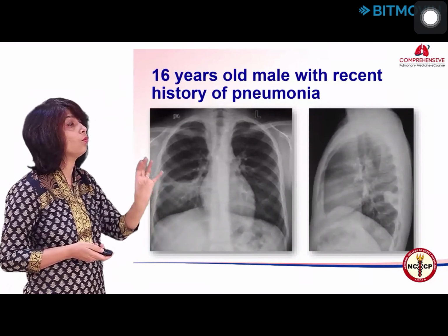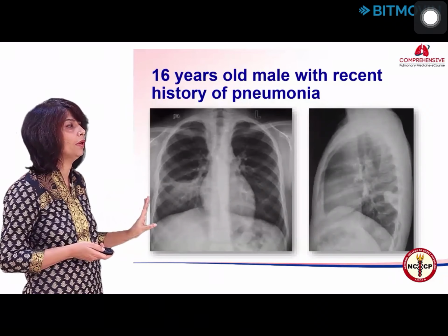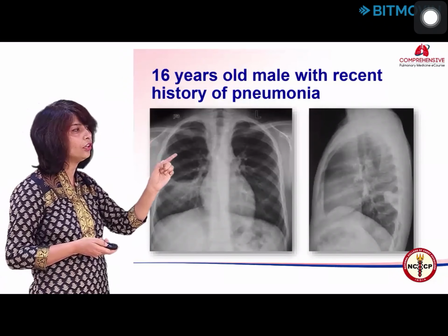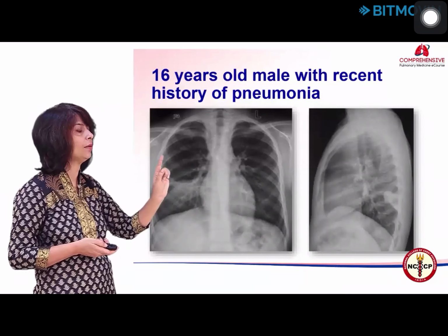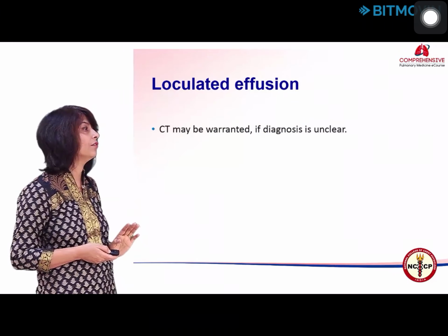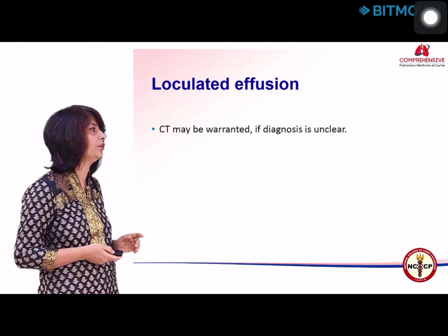So as I said, watch out for these small pockets. Nothing is to be done about them, because you don't need to prolong therapy, nothing reaches that pocket. But it is important to recognize that on a frontal radiograph alone it can get confusing because there's surrounding fibrosis, but combined with a lateral radiograph I know that this is loculated fluid. You can verify it on one CT, but that's it, and you can stop.